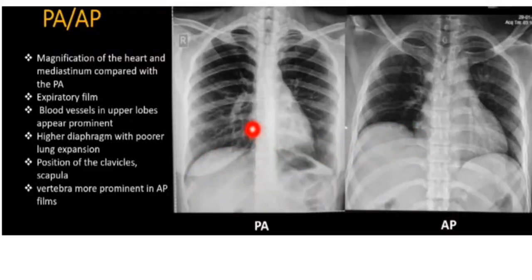The other difference in a PA X-ray: the vessels in the lung, the vascularity of the lung, are more in the lower lobes of the lung, especially the right lower lobe zone. Here you can see the right lower lobe has more vascularity, and you can also see some vascularity in the lower zones on both sides.